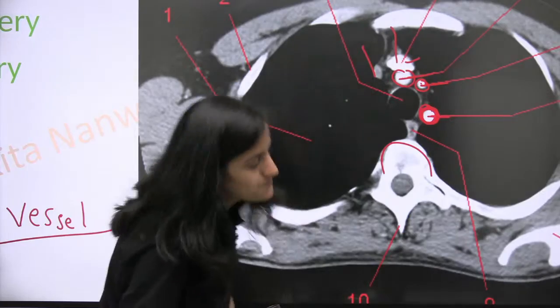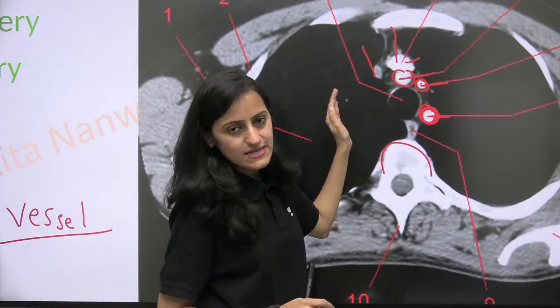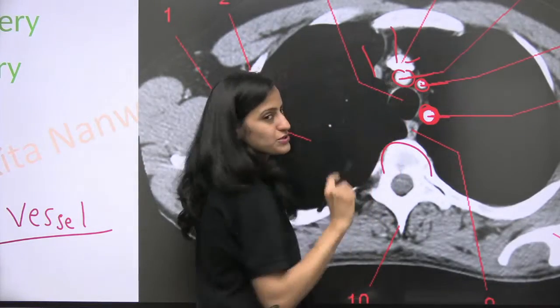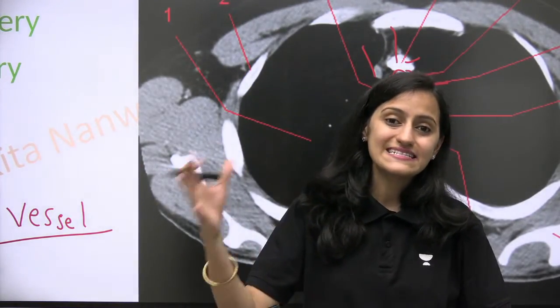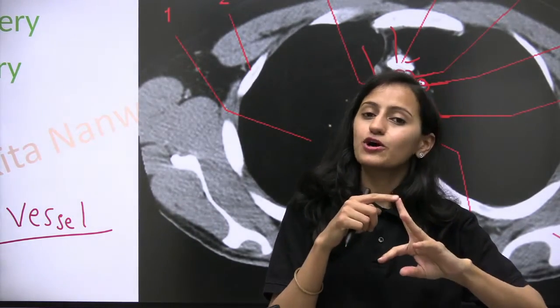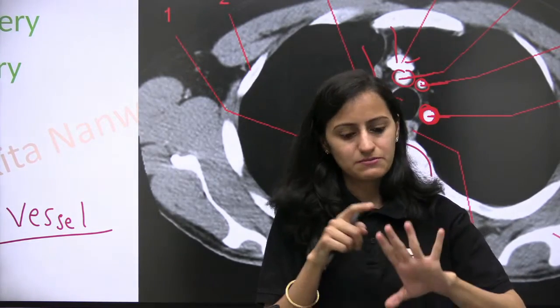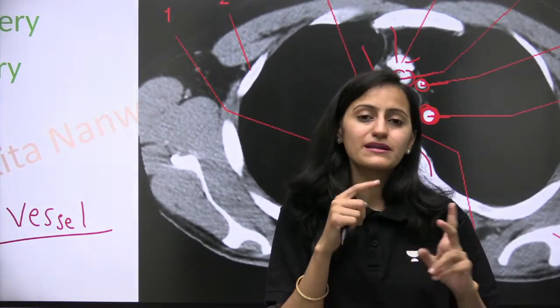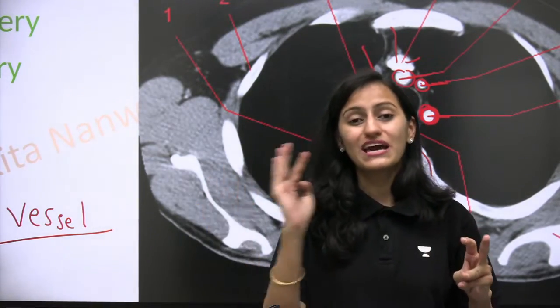After that, the first vessel that you see on the right side, the branch of aorta. What are the branches of the arch of aorta? Remember ABCs. That is, from the arch comes BCs. That is your brachiocephalic trunk, common carotid, and the subclavian, BCS. Okay, you can also remember it as Bachelor of Computer Science. BCS are the branches from right to left.